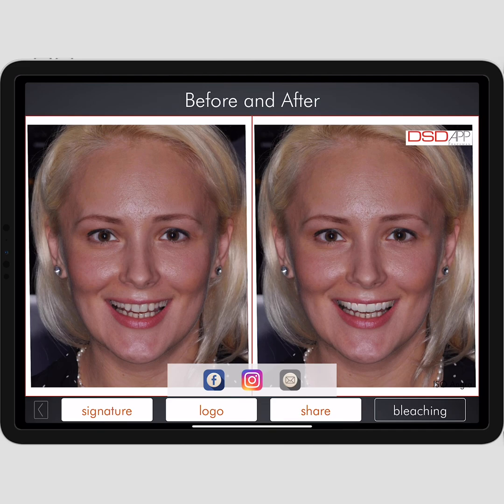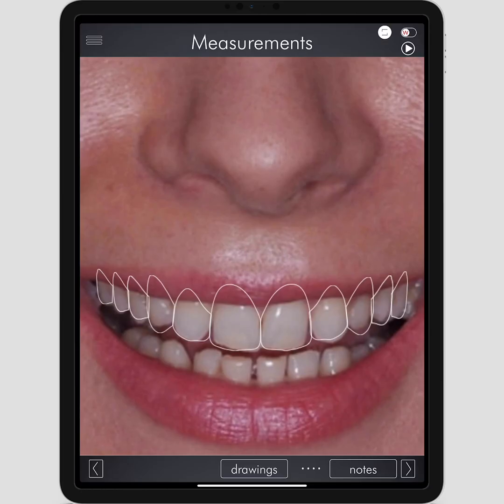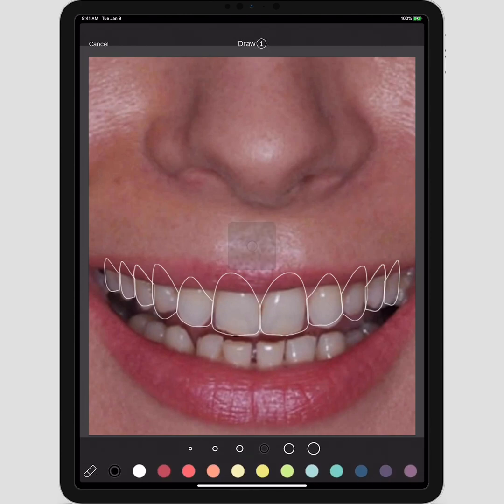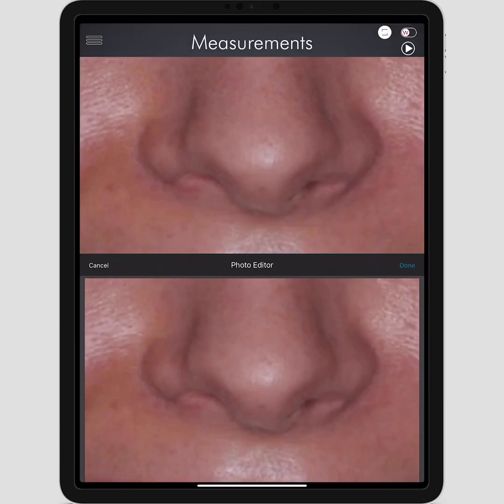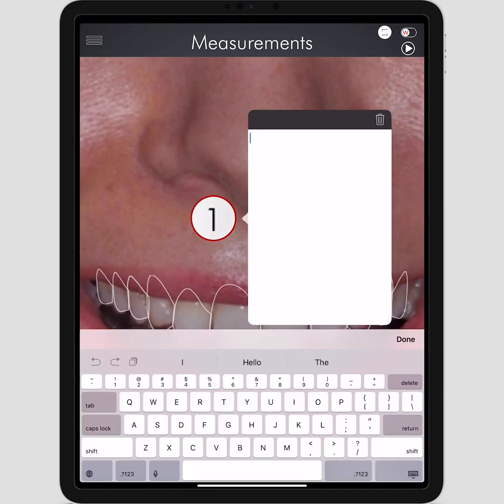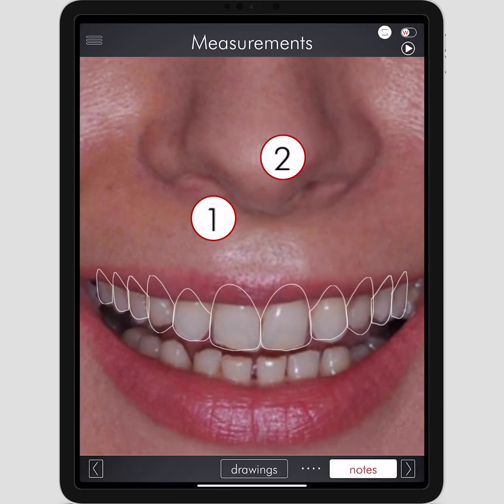Then let's go back here. And here you can communicate with your lab. You can make any drawings that you think it would help your team members or the lab technician understand your project. Then you hit apply. You can also add some notes by pressing and hold. And then you hit done. You can add more notes by pressing and hold.